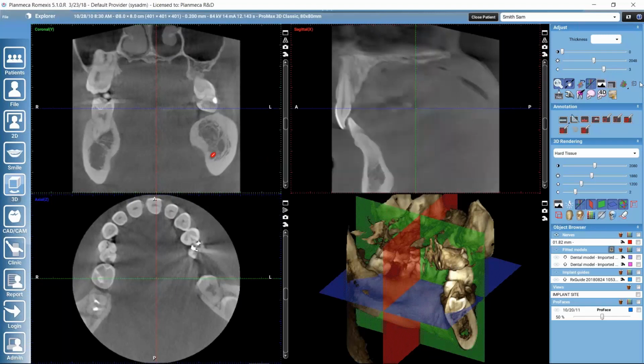And furthermore, one more thing for adjusting the images, there's a noise filter also available. So if we would like to remove some noise from the images, we could use the function here. Take a look at more information in the user's manual. Let's move on to navigating in the images.